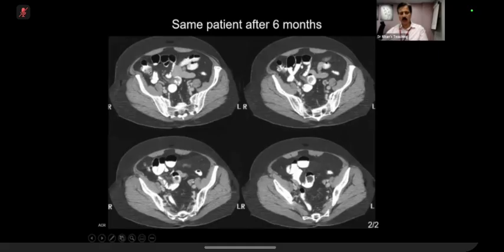If you see the mesentery is going in, please remember that people think that intussusception is always acute. It can be chronic and it might not be clinically evident. It is a degree of intussusception.